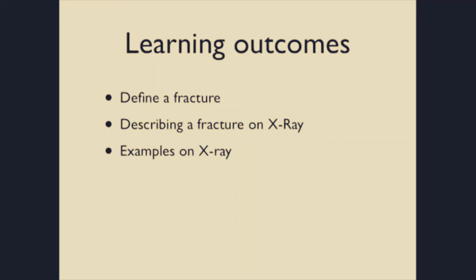So just to clarify, we've talked about the definition of the fracture. We've looked at the features you may identify on X-ray using some diagrams. And finally, we've looked through some common examples on X-ray.